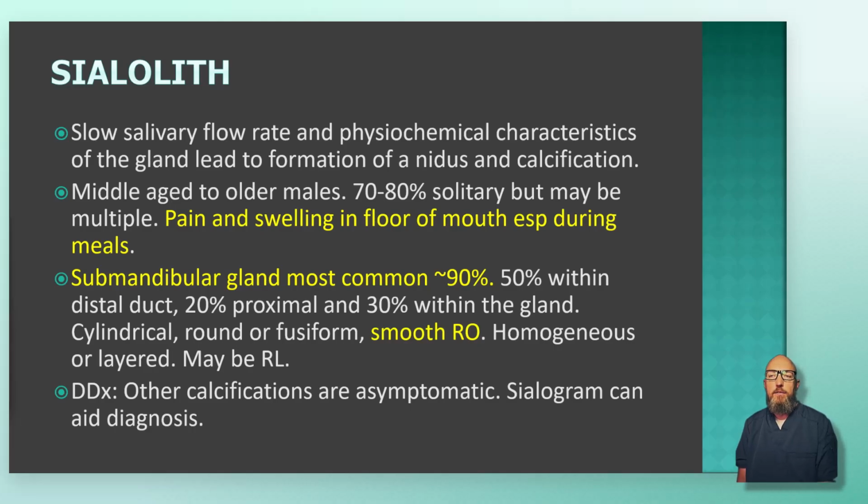Pain and swelling in the floor of mouth. And it's worse during meals. Salivation ramps up, the duct is obstructed, and pressure builds up. That's what causes the symptoms. Every other calcification we talk about in this video is asymptomatic. And so if the patient has mealtime pain and swelling, you're looking for a Sialolith.